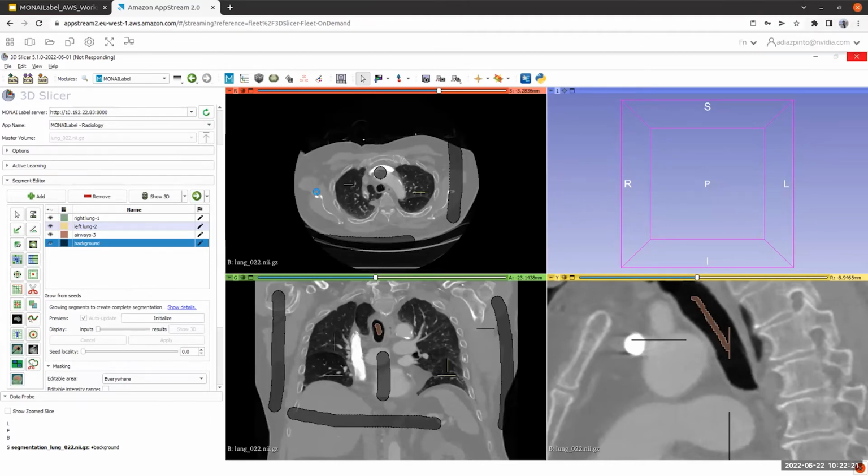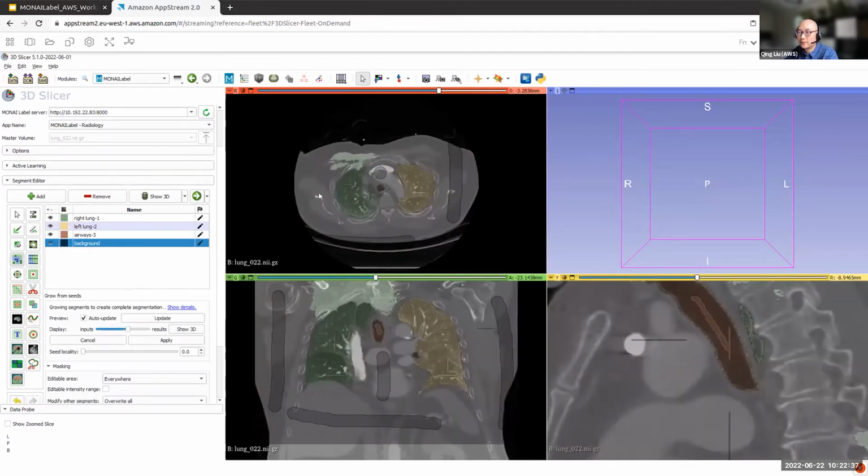Yeah, we are pre-downloading the lung data set that Andreas is showing from the S3 bucket into the MONAI Label server, doing all the setup ahead of time. So when you log in, you can just start using the data set without downloading. And since there's a unique one for every person in the workshop, it's all happening in parallel. Yes, we're downloading this multiple times, one per user.